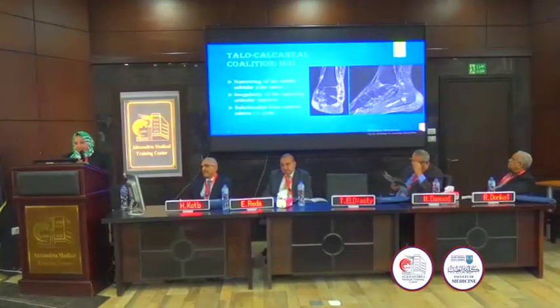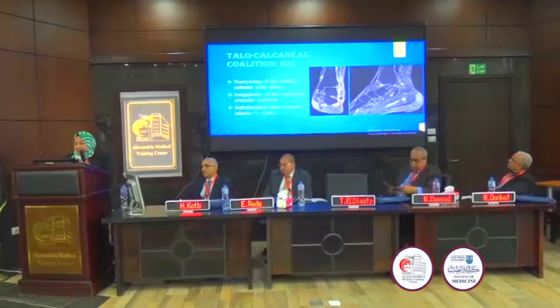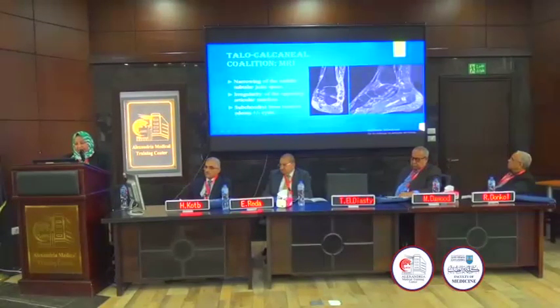And of course, by MRI, the non-osseous type of talocalcaneal coalition will demonstrate narrowing of the middle subtalar joint, irregularity of the opposing articular surfaces, and the presence of subchondral edema along the articular surfaces of the middle subtalar joint.